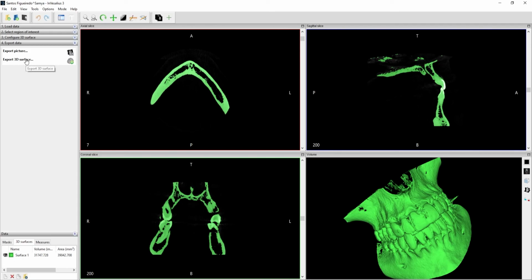as an STL file. So there, all you have to do is find the file, upload it to the drive of your choice, and you can go ahead and use it. Of course, if the file is too big, by being more than 50 megabytes, then please use one of our tutorials to reduce the size by using MeshMixer or MeshLab.